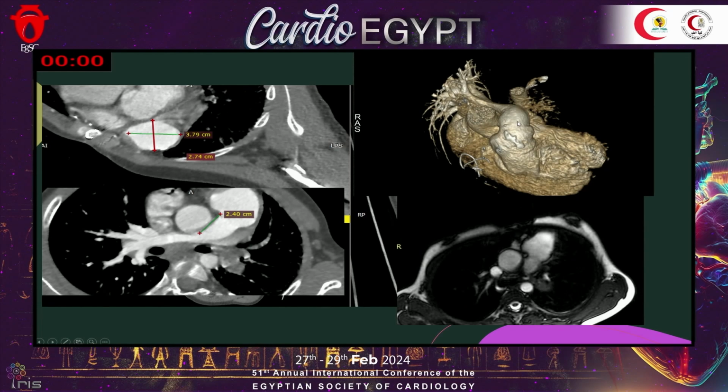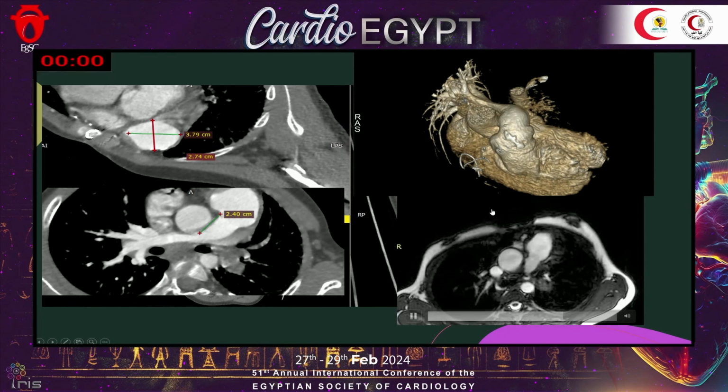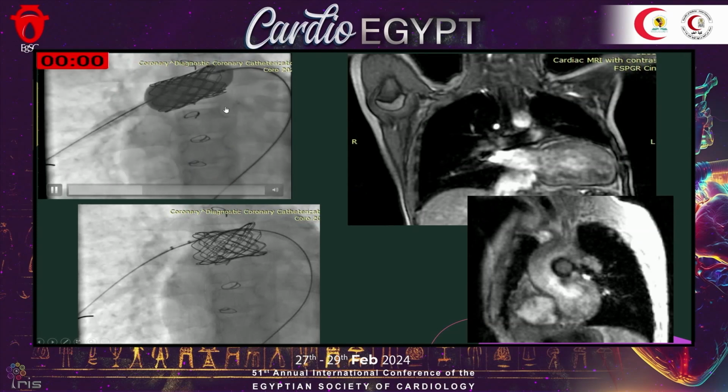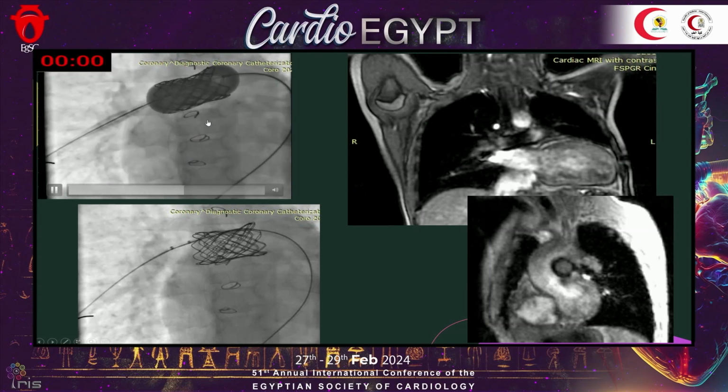However, this patient had a very interesting finding. Where is the left pulmonary artery? This patient had a congenitally absent left pulmonary artery. So the main pulmonary artery continues as the right pulmonary artery. And the right pulmonary artery actually had a stenotic origin. And then distally it measures 18 millimeters in diameter. So it gives us a very suitable alternative landing zone for melody valve, which is according to these diameters, it's the more suitable valve for such diameters.